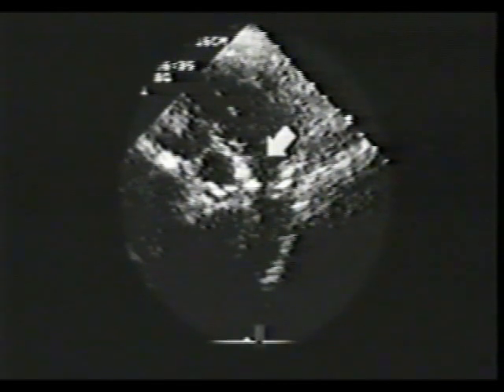In this view, note that the right ventricular walls are hypertrophied, right ventricular outflow tract is also dilated, and the pulmonic valve cusps are thickened and somewhat calcified. In this systolic frame, doming of the valve is also evident. For orientation, this is the aortic root with sclerotic aortic cusp seen. In real time, pay attention to the doming motion of the pulmonic valve.